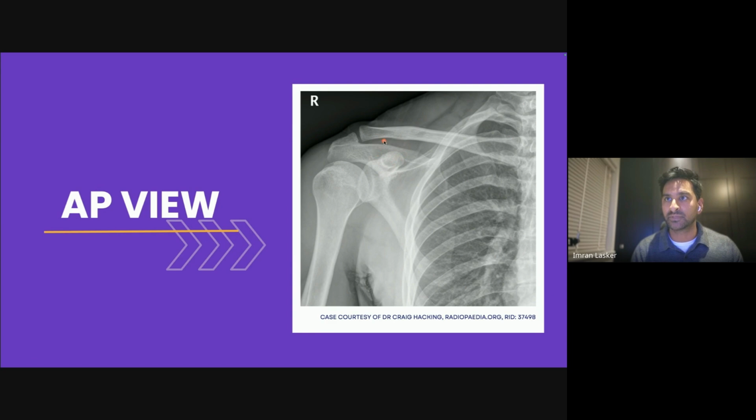Main thing is you do have ligaments that hold things in place. Sometimes you'll see some bits of bone that have pulled off, and this is just flying around in the wind because it's not being held in place.